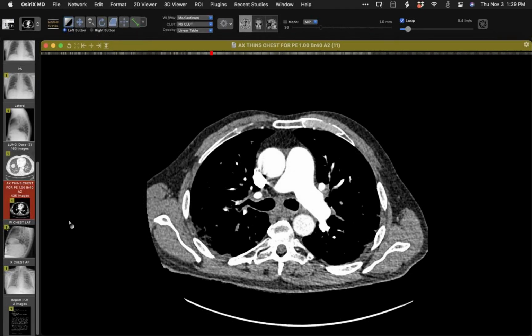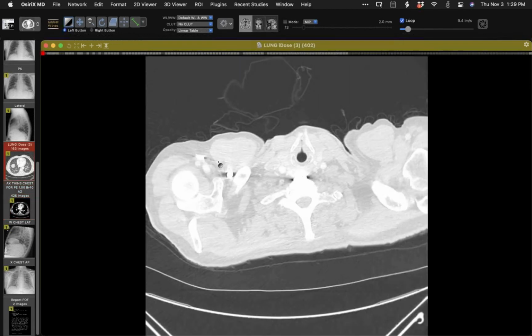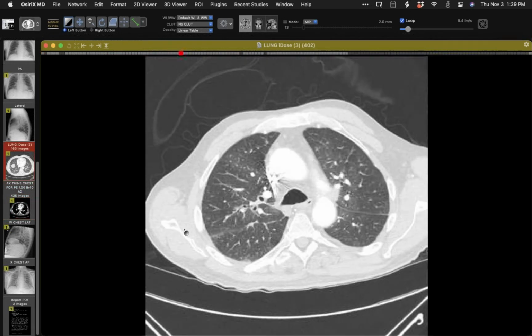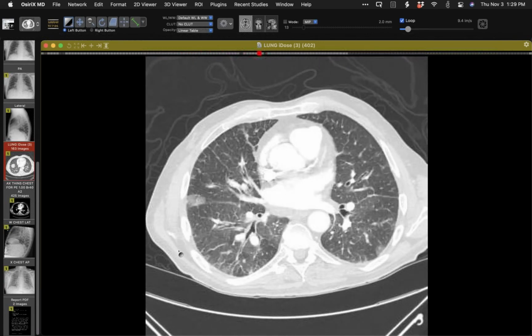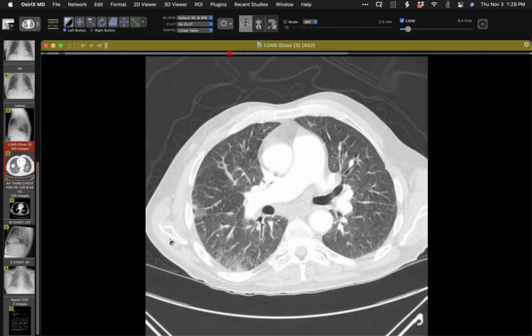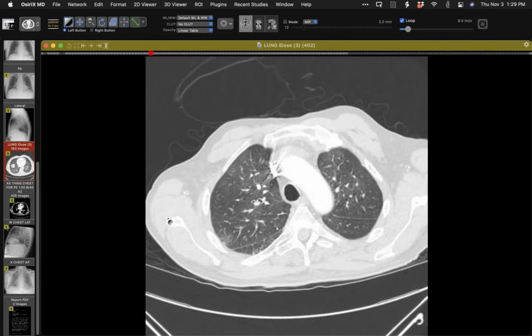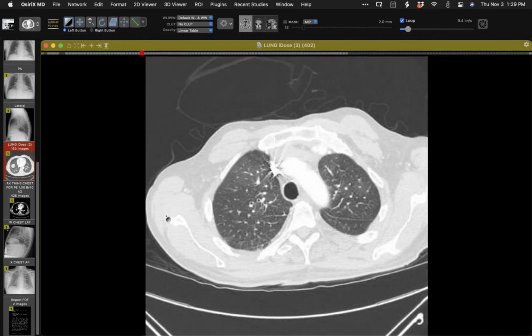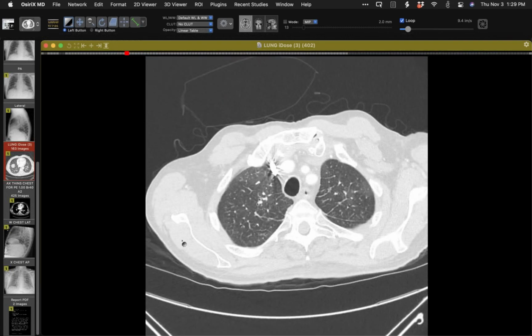Can you go back to the lung windows? Sorry, I was just pulling up another case. Sure. Say the lung windows here is May. I mean, whenever I see this, and with a normal left atrium, I'm thinking PVOD and along that spectrum, especially with the lymphadenopathy and the history of pulmonary hypertension. Yes, exactly. Exactly. That's what gets me going.